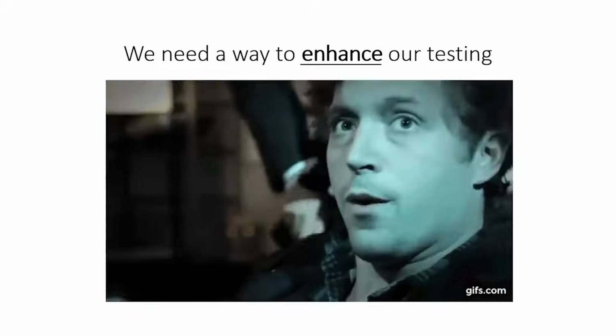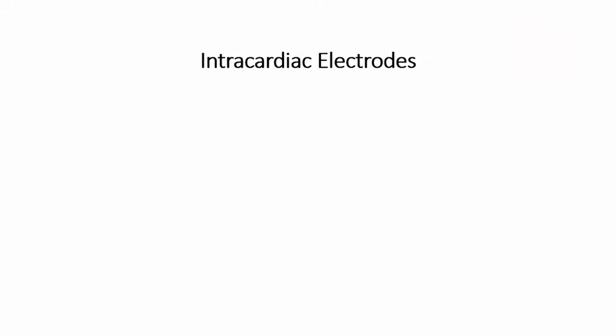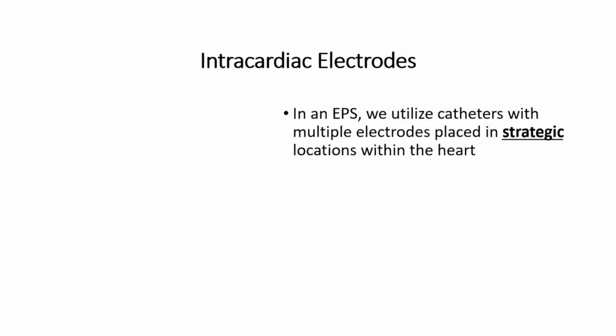So, with all that, we need a way to enhance our testing, to look a bit closer. Introduce our friends, the intracardiac electrodes. In an electrophysiology study, we utilize catheters with multiple electrodes, and we place them in strategic locations within the heart. Here's an example of one.